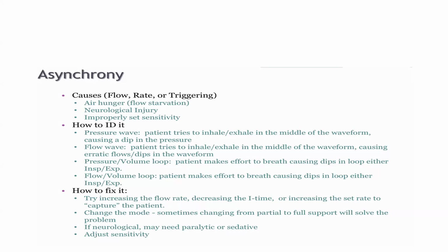Pressure volume loop. Patient makes the effort to breathe, causing dips in the loop, either inspiration or expiration. Then flow volume loop. Patient makes the effort to breathe, causing dips in the loop, either inspiration or expiration.